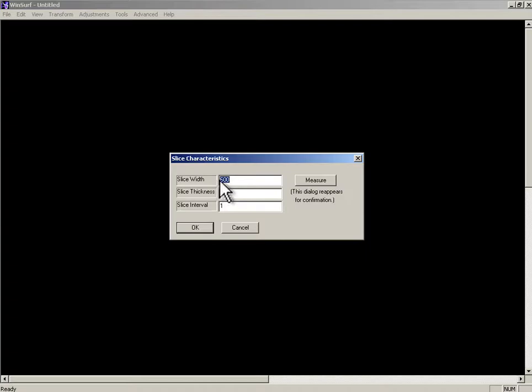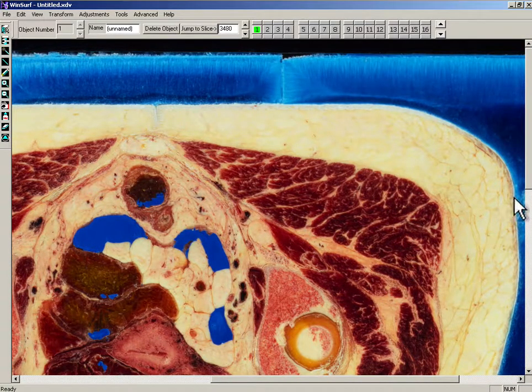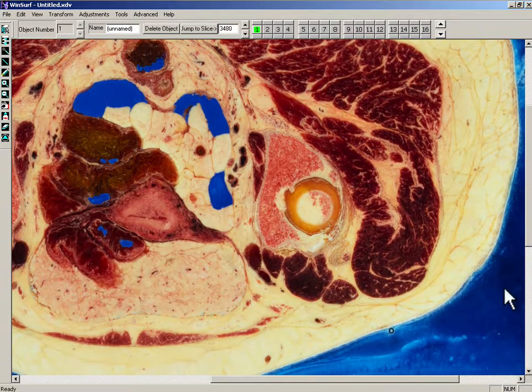Second, you have a window which is indicating the parameters of the 3D objects. In this case, for the visible woman USA slices, you should take 1,600, 1 and 10. The last parameter is a jump between the slices, and if you have a regular organ or regular shape, you choose 10 or 20. If you have a very complex shape, you will choose less.